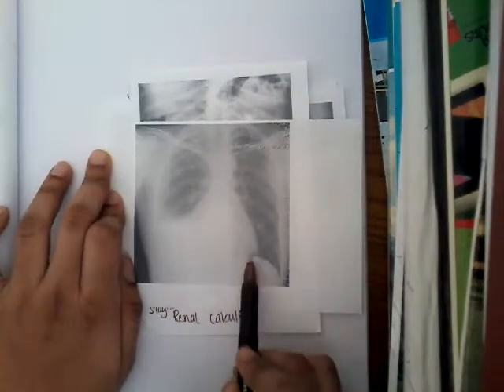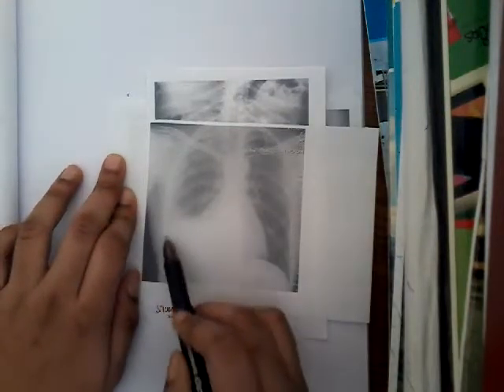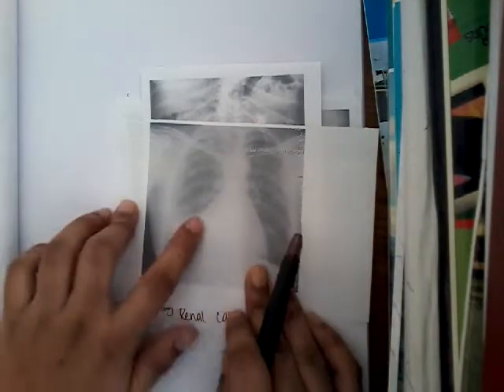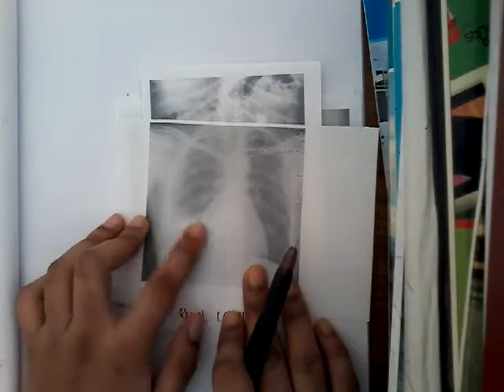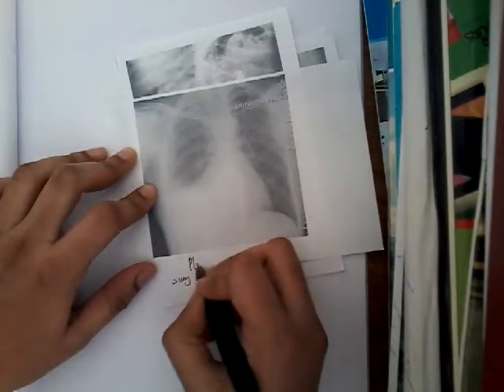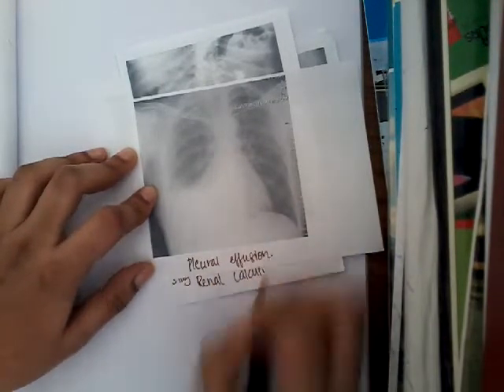On one side the diaphragm is normal, and the cardiophrenic and costophrenic angles are normal, but if you see on the other side, the costophrenic angle is obliterated. Here the costophrenic angle should be there. That costophrenic angle is obliterated, and even the cardiophrenic angle is obliterated. So because of the obliteration of the costophrenic and cardiophrenic angles, there is some opacity here. So this opacity is radio opaque, so it is most probably pleural effusion. Okay, so these are the surgery X-rays, the 4 surgery X-rays which I have in my practicals.